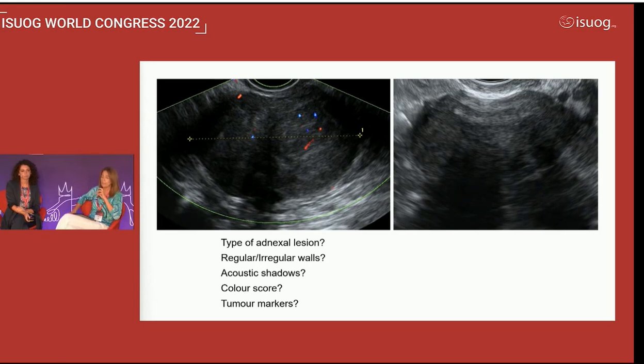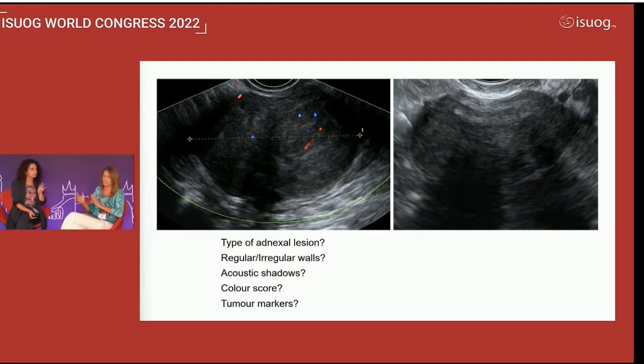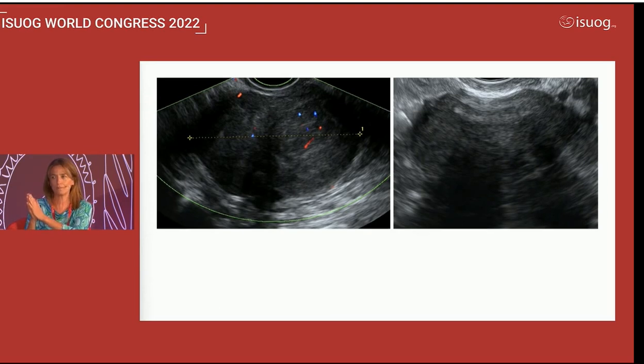So, in front of a solid lesion like this one, in my mind, I put also the possibility of metastasis and also another stromal ovarian tumor that we are going to discuss later, I suppose. So here I would exclude metastasis. I cannot exclude 100% another. You would exclude metastasis because of the vascular pattern? Mainly, and also, I don't know, is it unilateral or bilateral? It's unilateral. This is crucial, because I would exclude metastasis. But again, I have to consider all these possibilities, another possible stromal tumor.